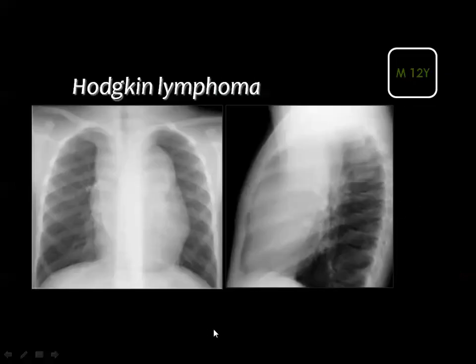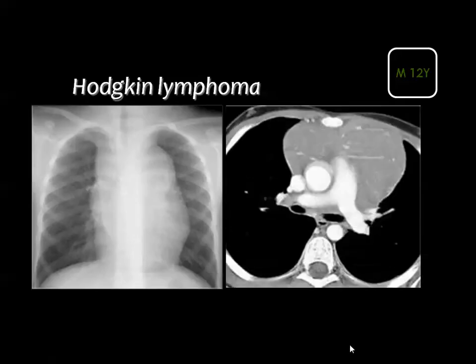pleural effusion. And in the plain film, you see broadening of the mediastinal borders, and you see lobulation of the mediastinal margin, and in the lateral view, you can see that big, relatively ill-defined soft tissue mass obliterating or occupying the retrosternal area. And by CT, you are able to see the mass which is present in the retrosternal area, compressing or relatively compressing the pulmonary artery and the aorta, as you can see here.